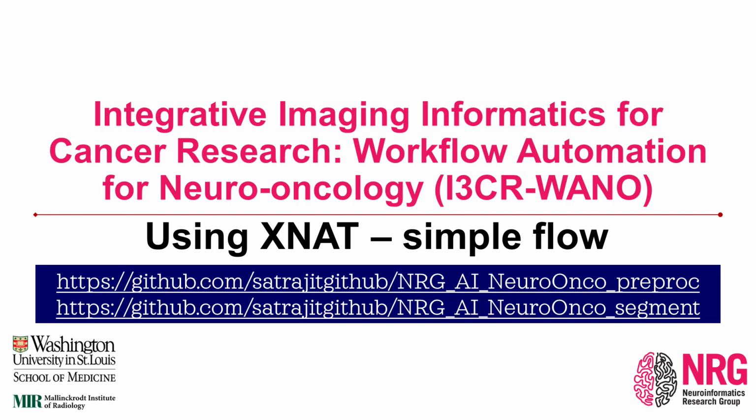Hello and welcome to the tutorial of I3CR-WANO. In this video, I will show you how to use I3CR-WANO using XNAT. In a different video, I have talked about how to use I3CR-WANO using Docker, but in this video, I will restrict myself to just the XNAT usage.